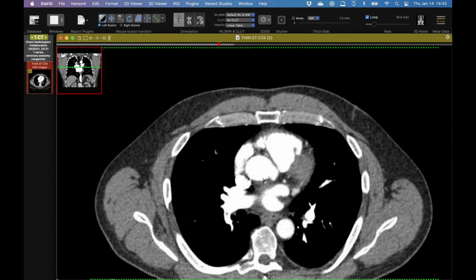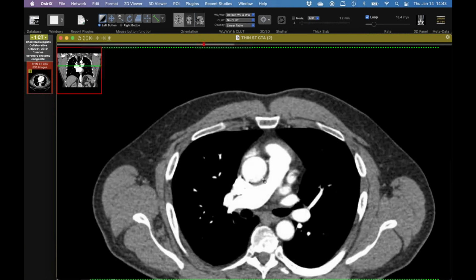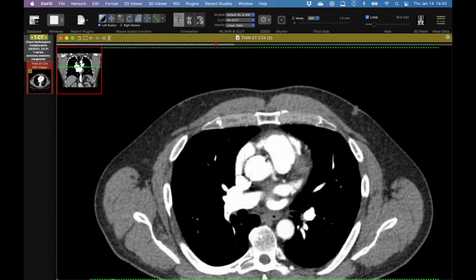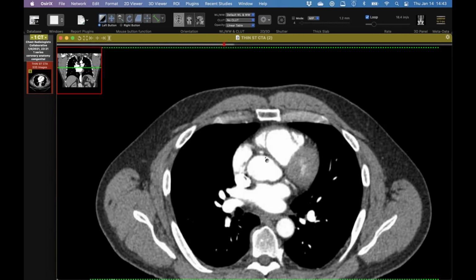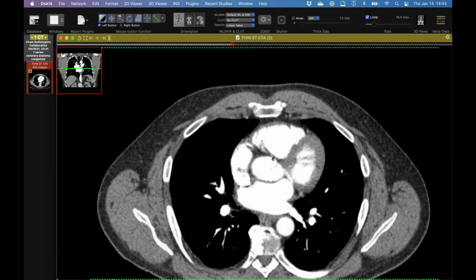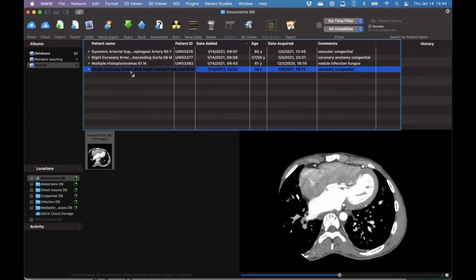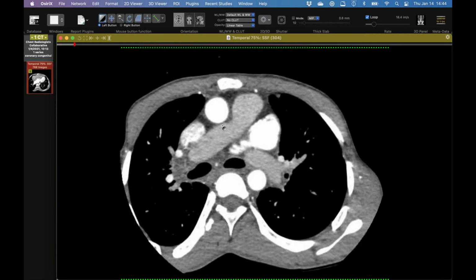This was just one I came across, and I don't remember, this was a PE study for something. And I'm always looking for coronary anomalies because the literature says it's like 1% of caths, but those are probably little peripheral ones we don't see. But I thought this was really cute. I know I've seen them before, but it's been a while. This RCA comes right off the ascending aorta, well above the sinotubular junction. We're at the level of the PA, and it just slides right down there and goes out and does its business.